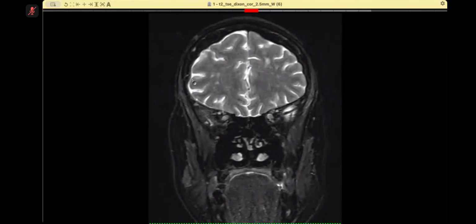So candidate 2, yes. I'm going to ask you leading questions on this one. This patient has history of breast cancer. She is a 66-year-old female. Since last 2 years, she has been stable.